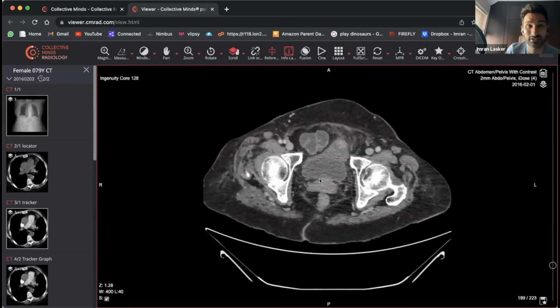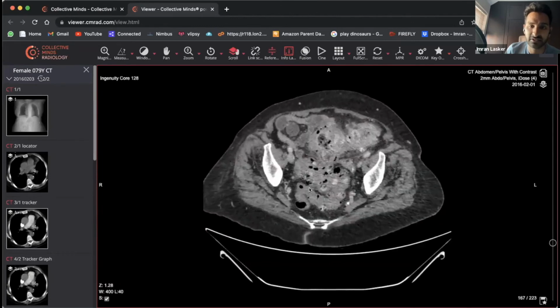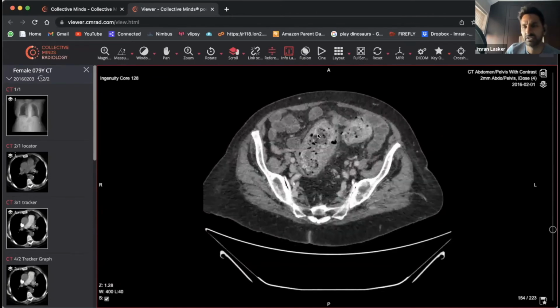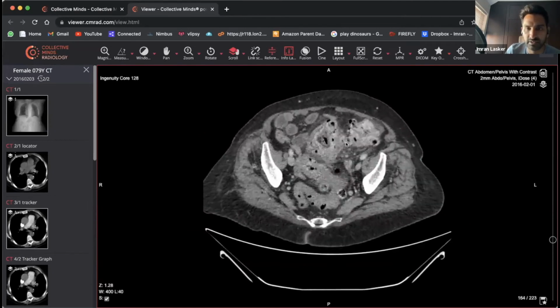So now we're going to do a bit of legwork. We've really got to get stuck in and look at the bowel. So let's follow, and we can see that kind of zigzagging thing over there. And coming up to this region, you can see that looks a bit fecally loaded. And actually, if you look at the fat around it, it looks very, very abnormal, right? And you're coming up to here, coming up to here.